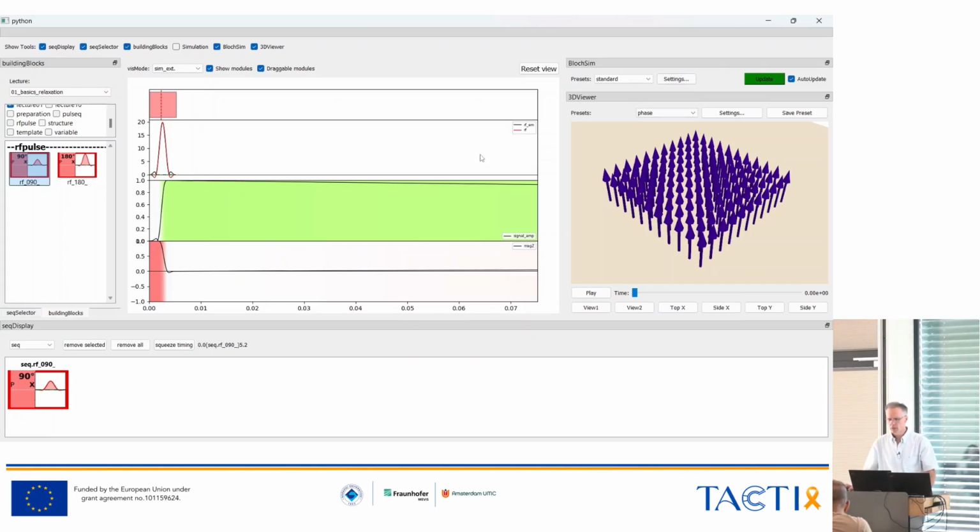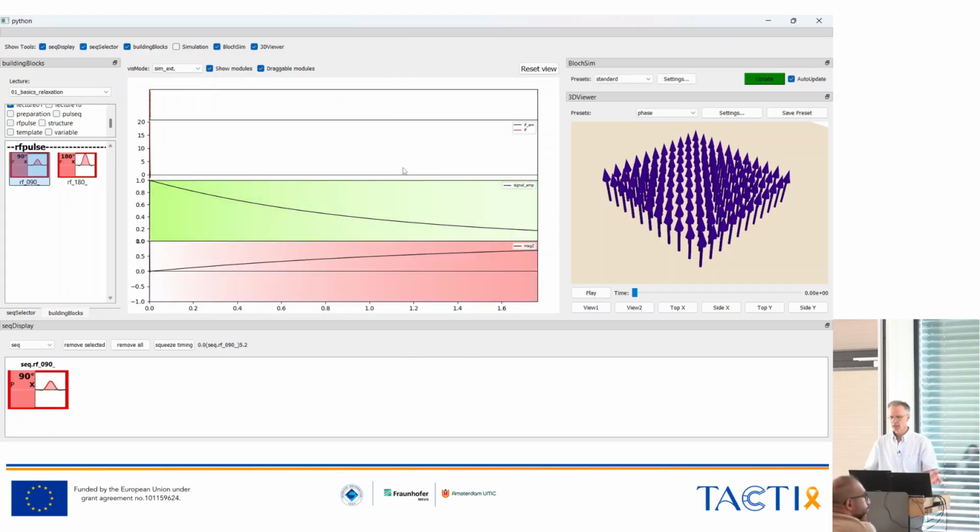With 11 by 11, the system should be fast enough to zoom out more or less in real time and automatically simulate an update. If you are simulating more magnetization pieces later on, you can go up to, I think, 100,000 or so.